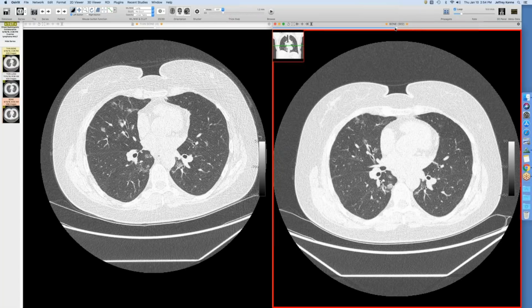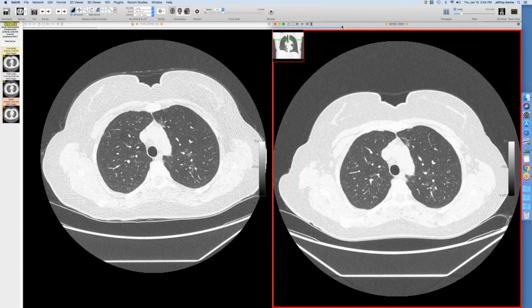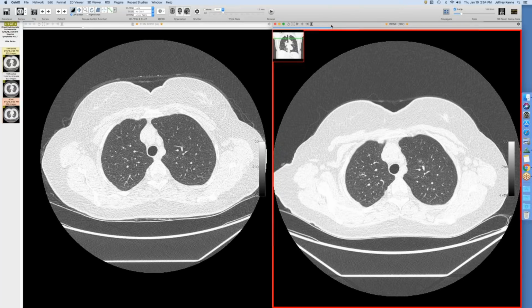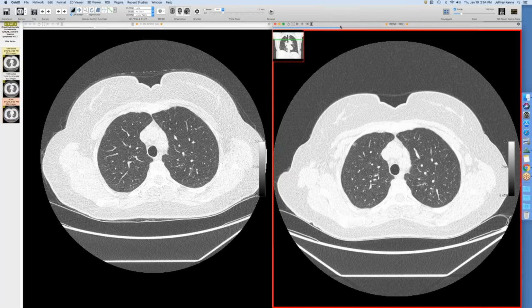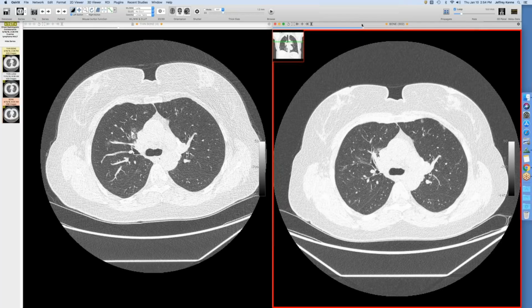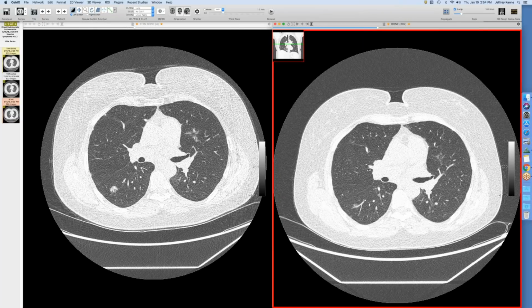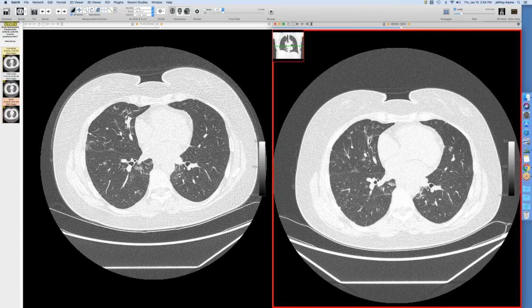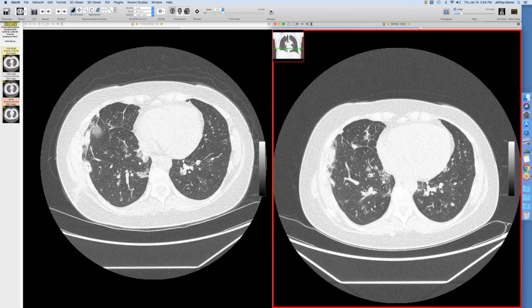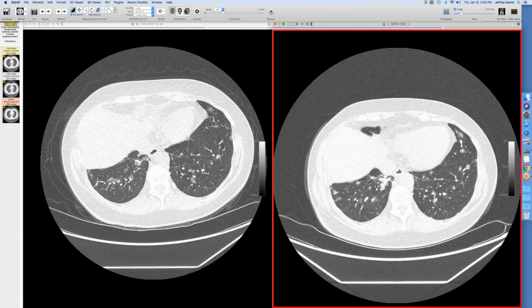And eventually these were biopsied, and instead of adenocarcinoma, this was all MALT lymphoma. So this is one of the more extensive cases of primary pulmonary lymphoma I've seen with the MALT type. I've seen ones with solitary nodules, I've seen them with a handful, but this one is quite extensive. So the presumption is all these ground glass nodules are actually areas of extranodal marginal zone lymphoma and not anything else. And the distribution along the airways is quite typical when you see this along the lymphatics of the airways.